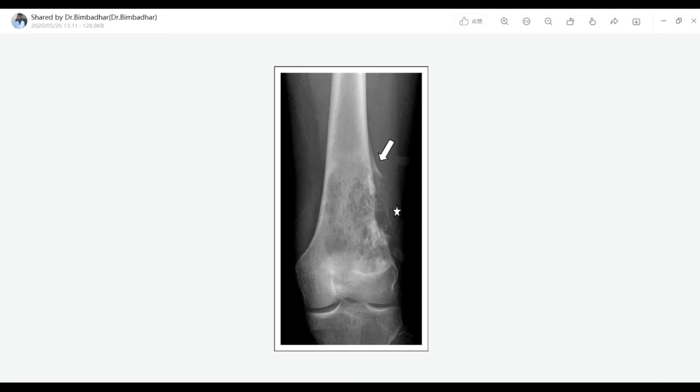Aman, look at the picture I have sent you. So that is how a Codman's triangle is, right? Can you see it now? Did you understand, or do you want me to still explain in more detail?